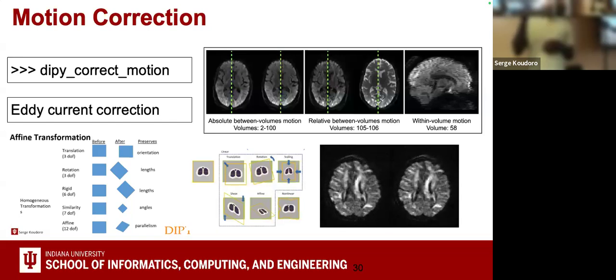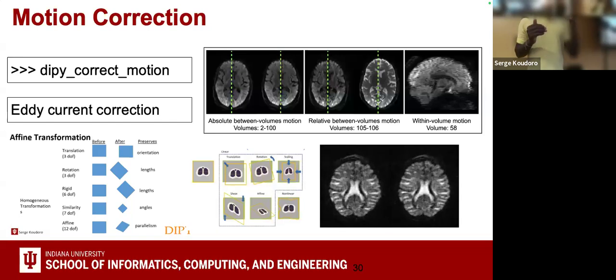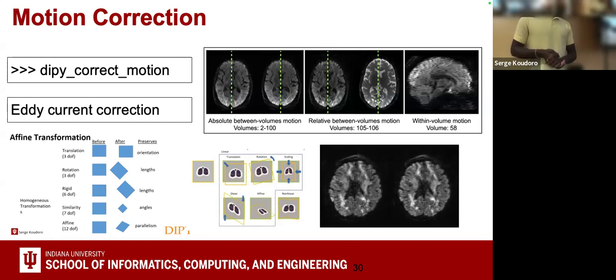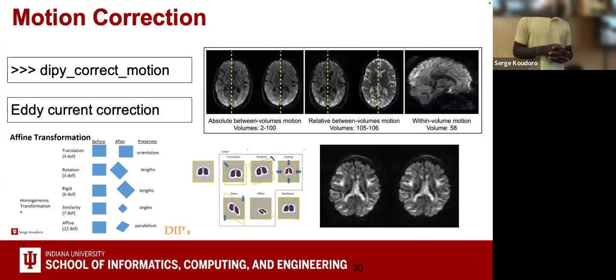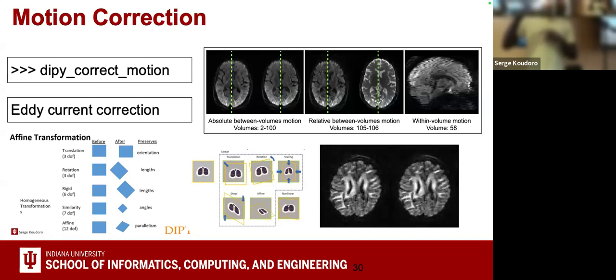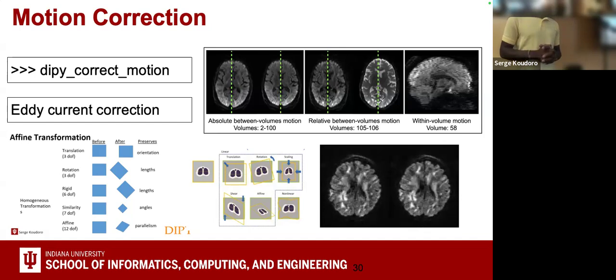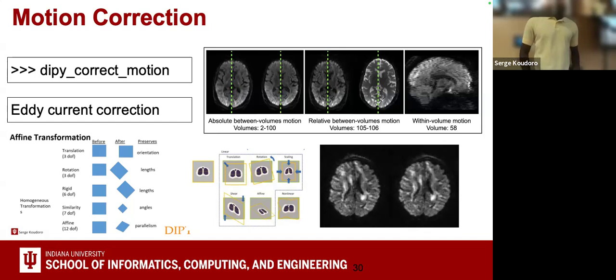So you have correcting the displacement and correcting the intensity. So combining these two methods does the eddy current correction. Of course, we could do better and have a specific dedicated algorithm if the intensities are really crazy, because the intensity normalization is really the hardest part, but it's not always necessary, depending on your data.